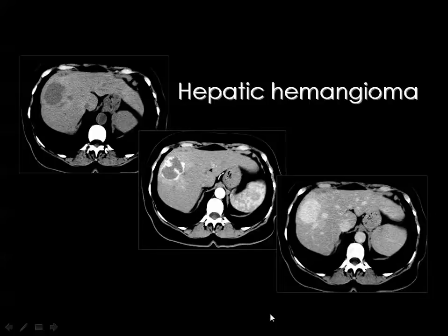Then you should not assess the lesion whether it is cystic or solid unless you have a contrast study, whether this is a CT scan or MRI. And you are not allowed to assess the nature of the lesion in the pre-contrast scans, otherwise you will have many mistakes. Then in the post-contrast scanning, you see enhancing mural nodules, and this is the character of the hemangioma.